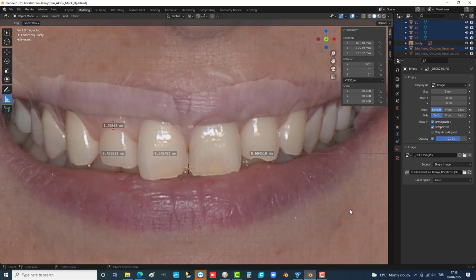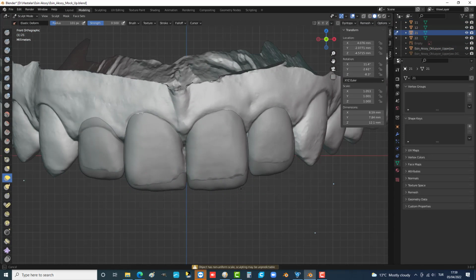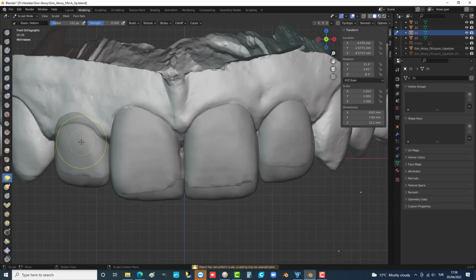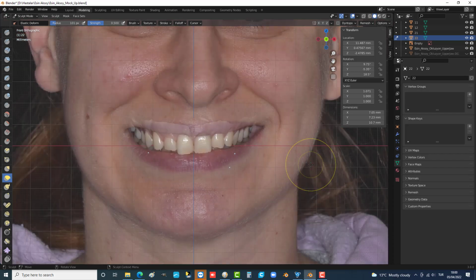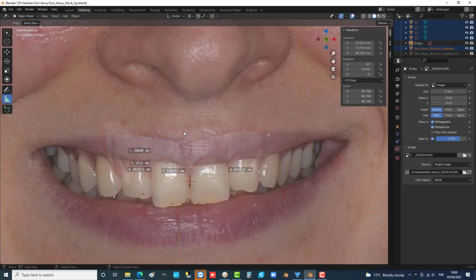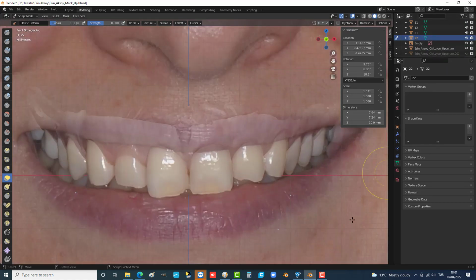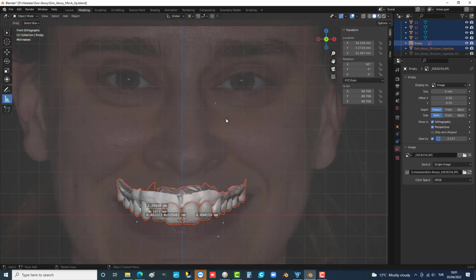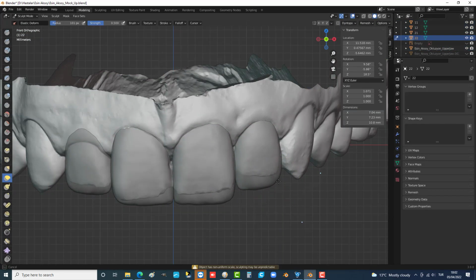We can use the patient's own teeth forms or STL teeth libraries. The sculpting tools are great as well, so we can prepare a mockup in about 15 minutes. We can either print the model or show it to the patients on the screen. If we need to change something, it takes just a couple of minutes.